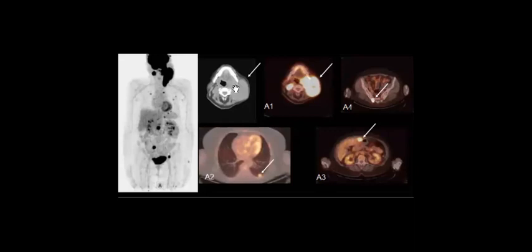Then, Rabab, you start to characterize the site, the location. Maybe a submandibular extension. So you think that maybe it has lymphadenopathy as well, right? Nice, Reem.